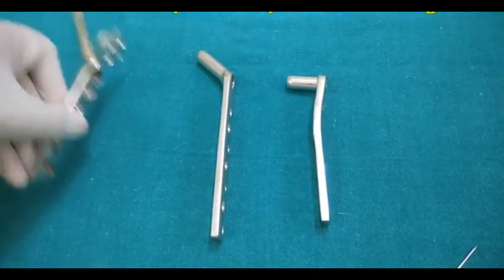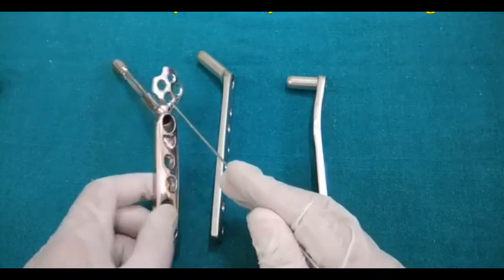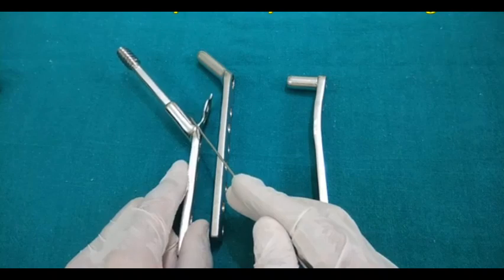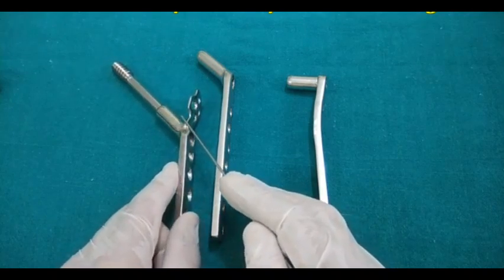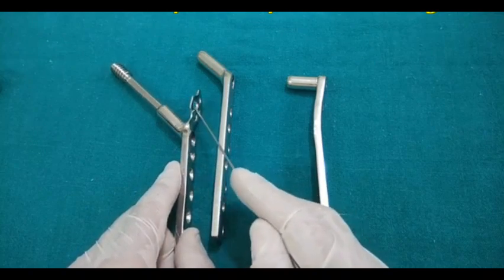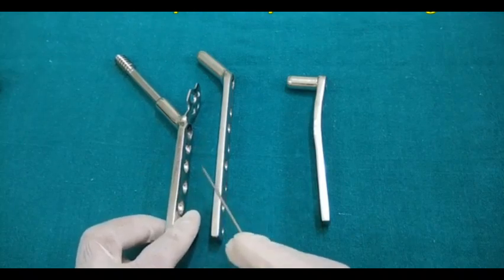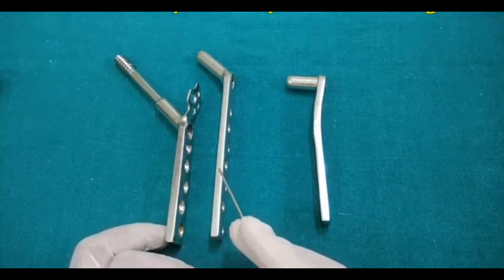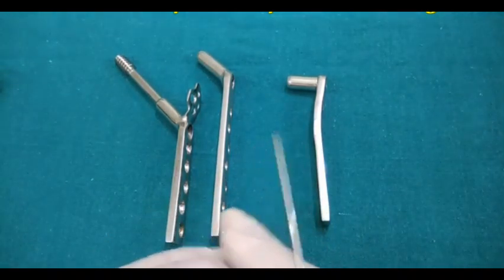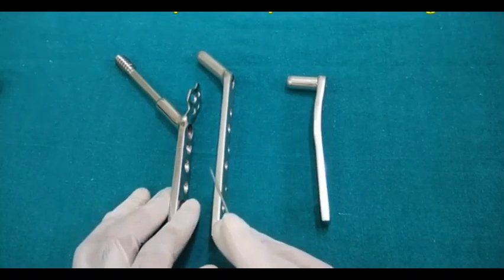Another plate which I want to have a look at is this. It is the same as DHS, however it has an extension of the plate over the greater trochanter. So this is actually a trochanter stabilizing plate. The indication is where you have comminution of the greater trochanter or the lateral wall of the greater trochanter, then you use this trochanteric stabilizing plate. However, this is now not being used. It is going out of favor, mainly because of the PFN. Now the implant of choice for the intertrochanteric fracture, for unstable fractures, for lateral wall comminution or greater trochanter comminution, is the proximal femoral nail.